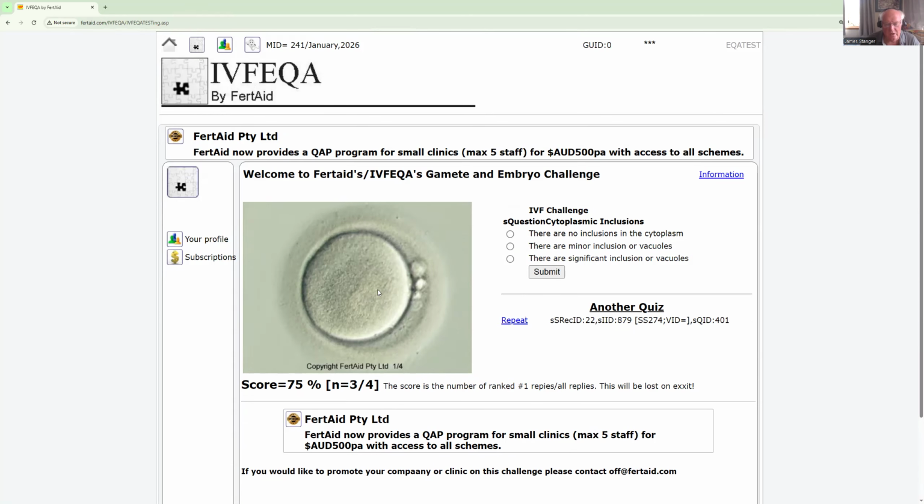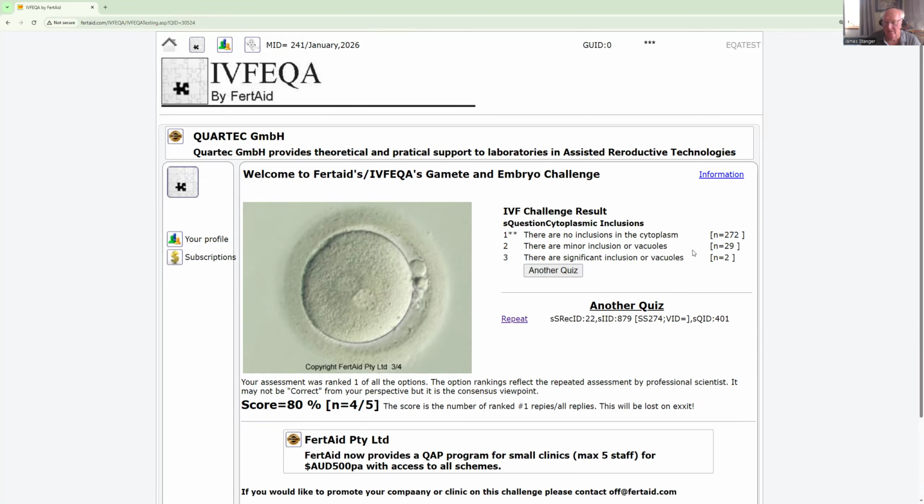You just have to sit, and I'm wasting a lot of YouTube video time. I will actually say that there's no inclusions in that. And in fact, of the 300 odd people that answered that question, not everyone agreed that there's no inclusions.